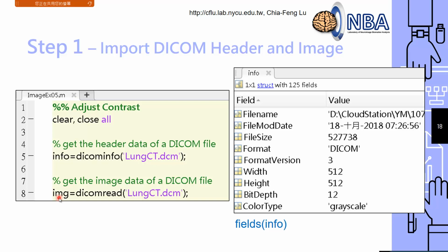It will become a part of your homework, so just do it right now. And if you like, you can also use the functions that we just learned, fields. You can try to key in this information in the command window to see what are the fields that we have under this info structure array, okay?